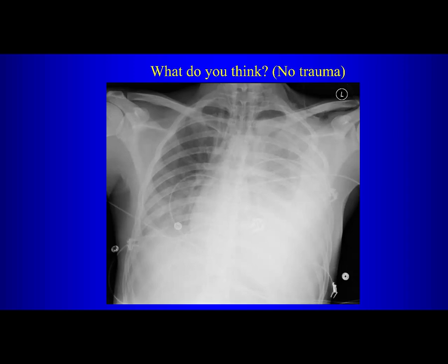Looks like there's maybe some lucency. Well, what about this stuff, right? So there are these streaks of air here extending up into the neck. So does the patient have pneumomediastinum? Yes. What else would you look for? Mediastinal shift.